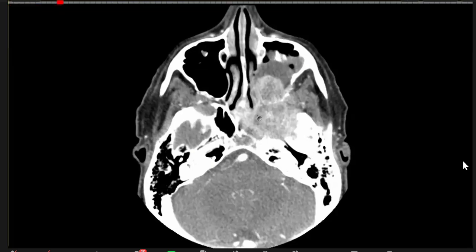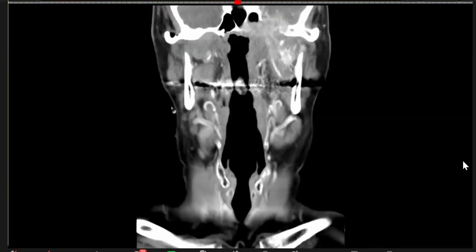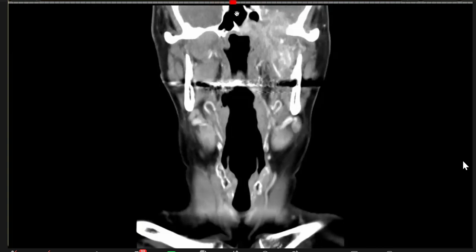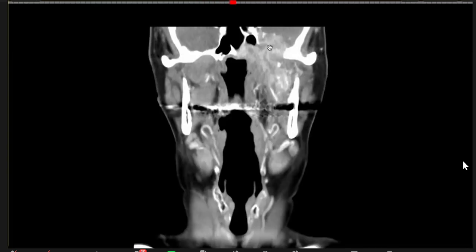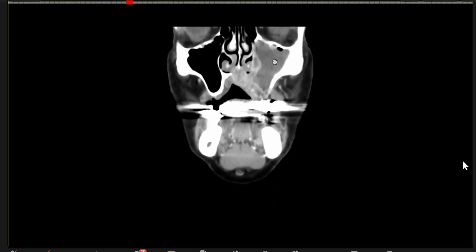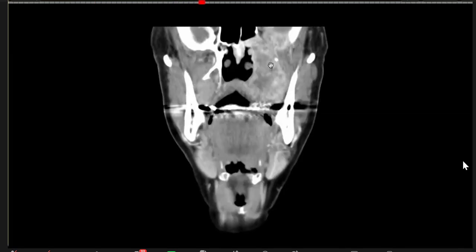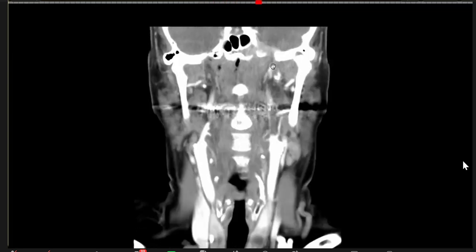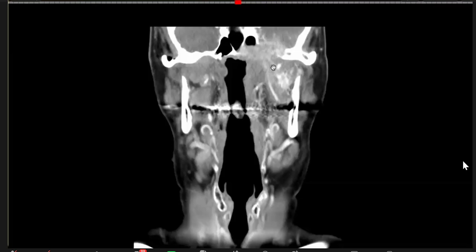Of course, it has gone into the coronal. Even here, actually at the edge, we can see it. So it is going into the cranial cavity. So here you are. This was picked up, which was fine. But posteriorly, the whole of this exercise is about what else is involved, things like that. Okay, overall you did well. Okay, thank you. And second last case of the day.